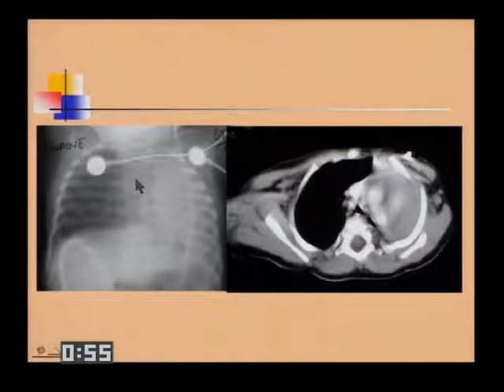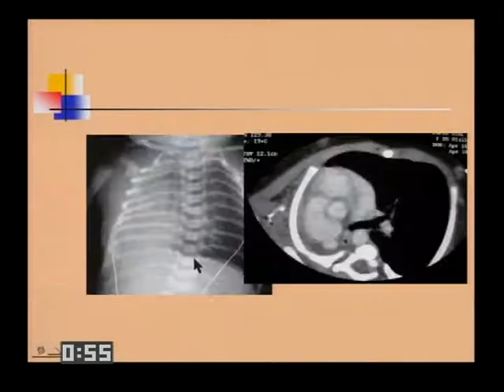This child has another abnormality. He's got a ventriculoperitoneal shunt tube in place. And you would want to exclude occluding lesions or intraluminal obstructing lesions. It is seen in a higher association, again, in children who have the VACTERL or VATER association.